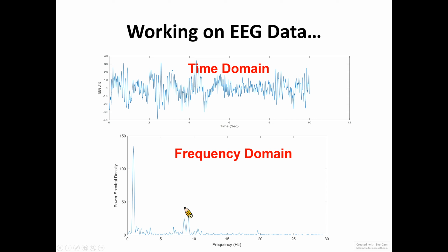And because this is not a course on biomedical signal analysis, but for your reference, I just show you how to convert the time domain data into frequency domain data. This frequency domain data can help us do the clustering analysis, because the time domain can vary in time length and sampling frequency, but the beauty of the conversion is that we can use the Fourier transform to convert the time domain to the frequency domain, meaning that we can find out the frequency components of this data.